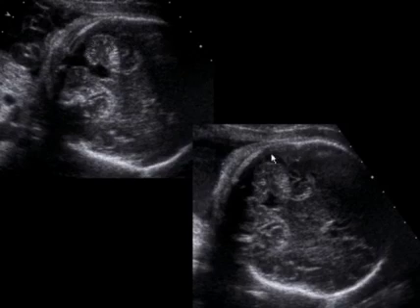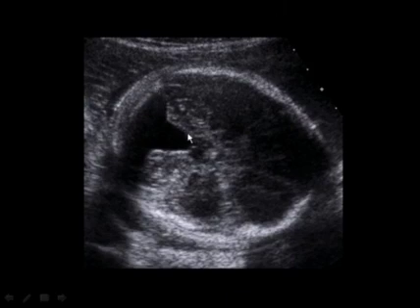And if the probe was tipped so that the calvarium is intact along the back of the posterior fossa, we see, as we do on this image here, that there is indeed a vermis and a distinct fourth ventricle, just in a different spot than was being imaged on the first image. Here's an example of a patient with a true Dandy-Walker variant. The fourth ventricle here is wide open into the cisterna magna, and the cerebellar hemispheres are flattened and distorted, particularly on the superior aspect of this patient with a true Dandy-Walker variant.